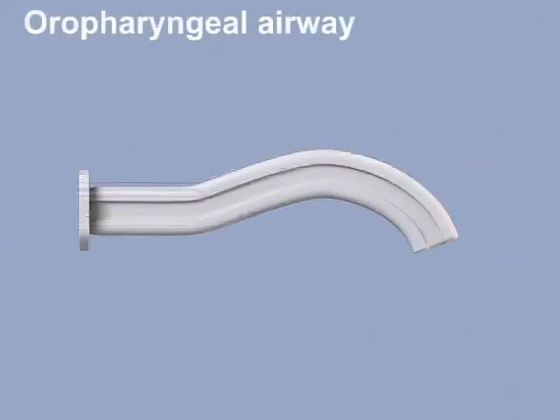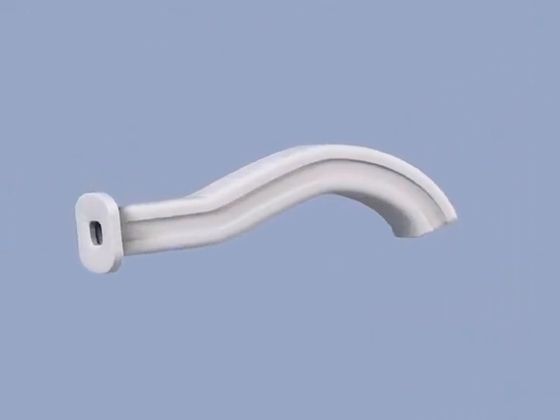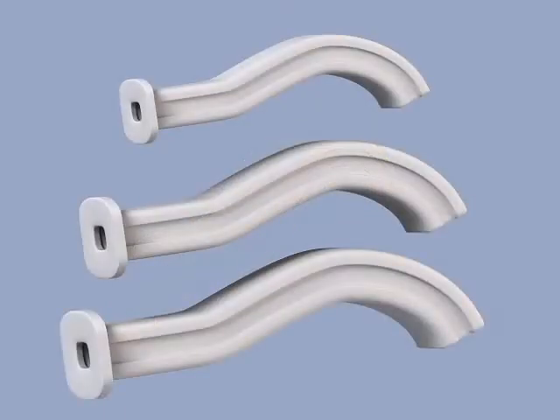Oral airways are firm hollow tubes that, when inserted, provide a conduit between the mouth and the glottis. These devices have flanges on the proximal ends that prevent inward migration. Oral airways come in a variety of sizes. Correct size selection is covered later in this video.